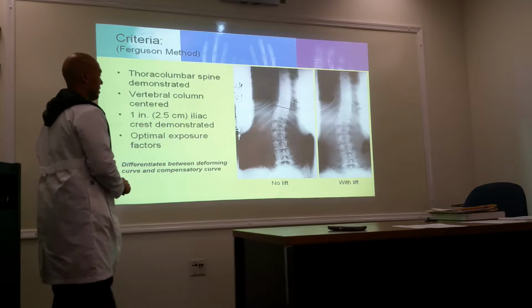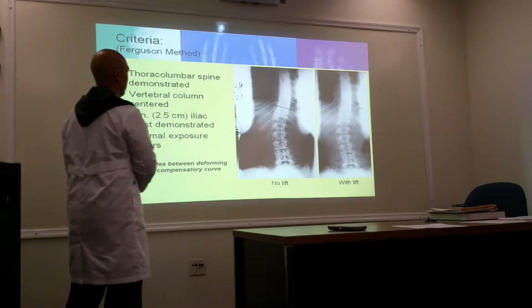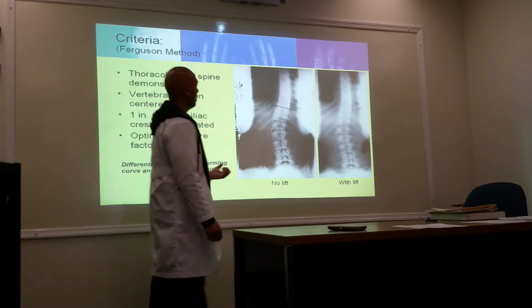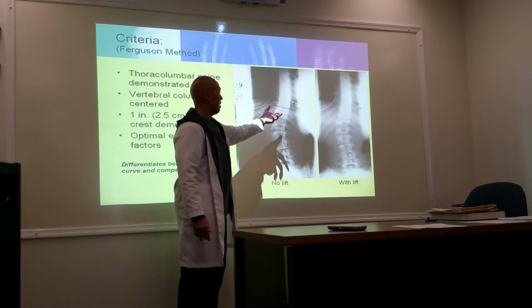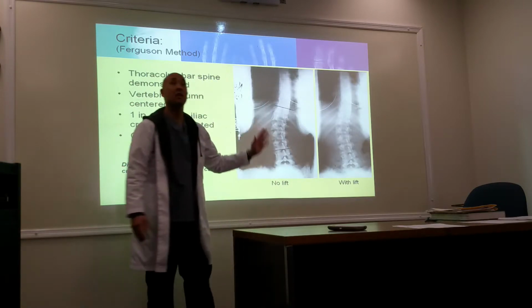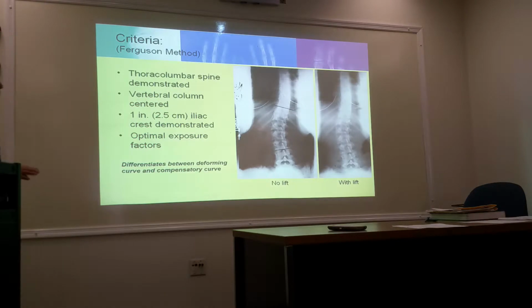All right, so here we have two images comparing the two, one with a lift, the other one with no lift. And you can tell, again, they're just looking for alignment. This patient's wearing a bra, they don't care. We have a bra, we're just looking at alignment. We're not looking for detail, we're not looking for resolution, we're looking for alignment. Okay.